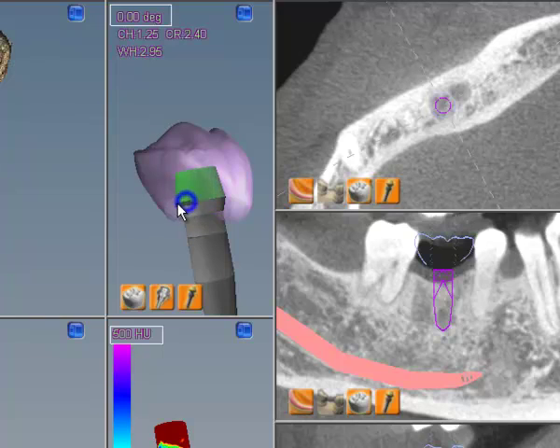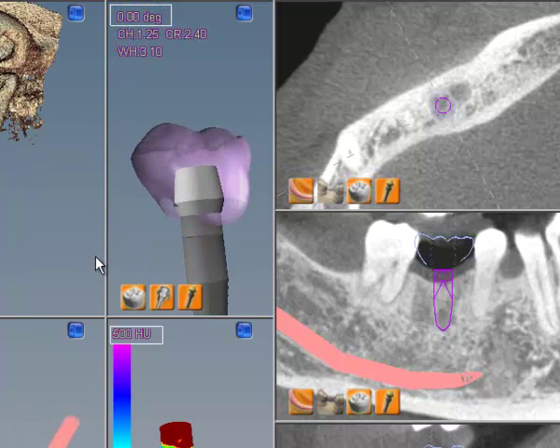To change the angle of the abutment, left-click the degree box in the upper left corner of the abutment view. The E4D Dentist system does not currently mill custom abutments. The abutment view is used to get measurements for standard abutments.